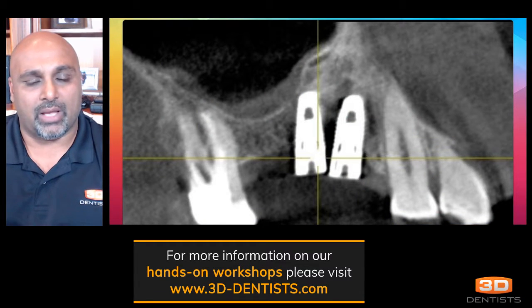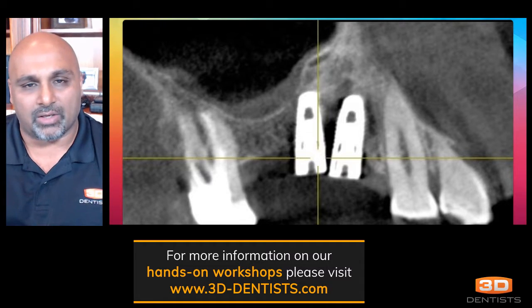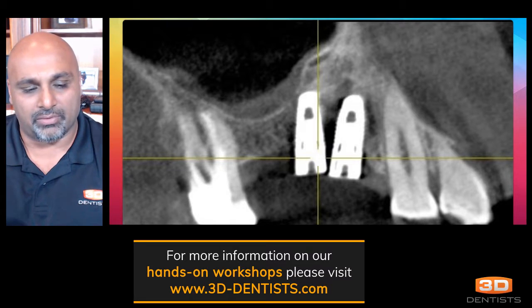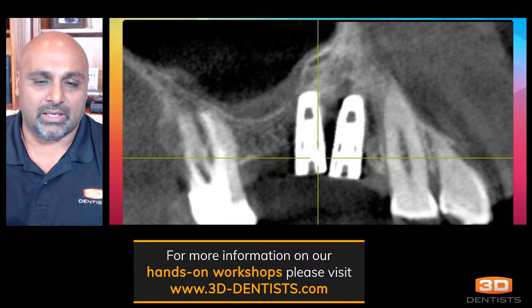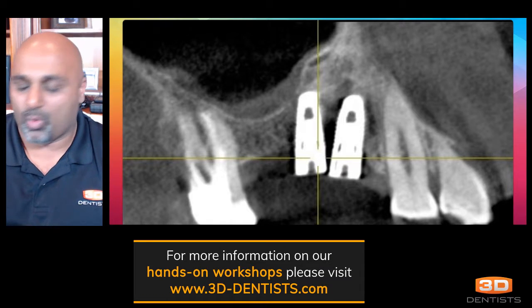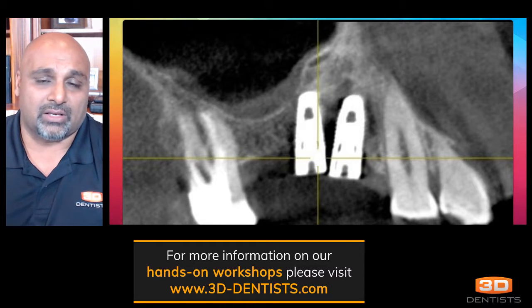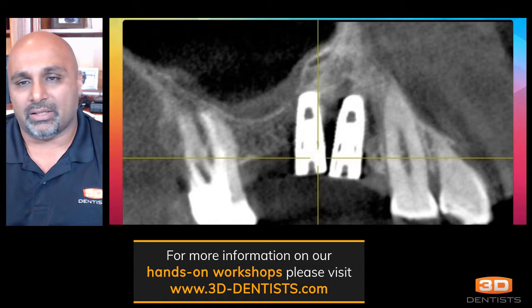So, I think one of the questions that we always ask ourselves is, why do we get cone beam imaging? And I think cases like this are a great example of why we got cone beam imaging. Really what this shows me are implants that are misplaced, making it difficult for us as restorative dentists to restore these. And I think one of the things that drives us to use this technology is being able to place these implants ourselves on our patients to avoid these scenarios.